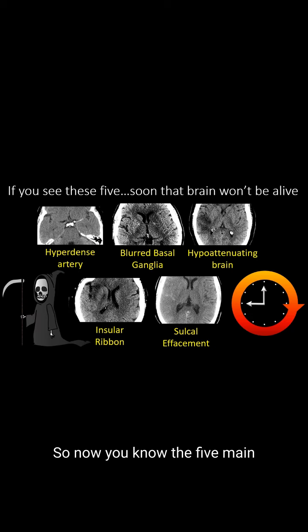So now you know the 5 main signs of acute infarct on CT. Remember, if you see these 5, soon that brain won't be alive.